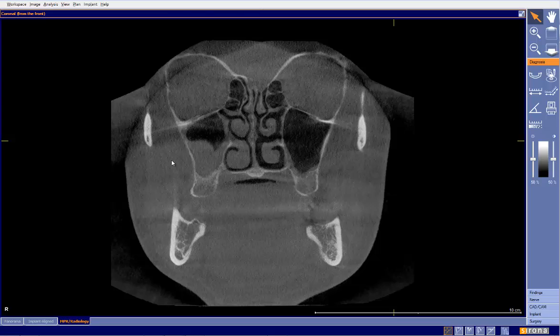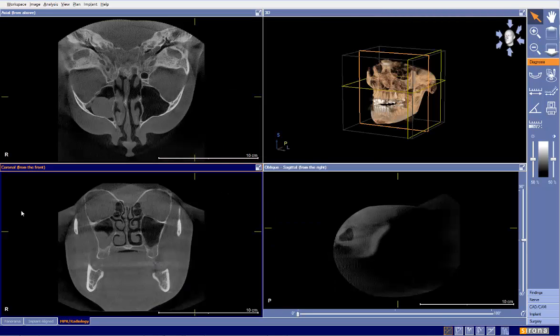In this case, my hygienist's antenna went up when she saw this, because they do the initial review of the scan just to showcase to the patient what kind of technology we have. She saw this difference, and we pointed it out to the patient. And the patient said, yeah, I've got sinus issues, it's been there forever, the standard answers. When I see sinus issues that go all the way down to the floor of the sinus, one of my first things to look at is, is this odontogenic in origin? Is this tooth related?